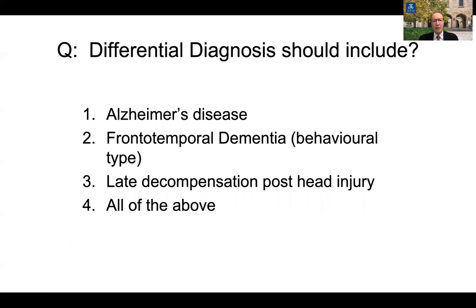Our differential diagnosis in this patient should include 1, Alzheimer's disease, 2, frontotemporal dementia, the behavioural subtype, 3, late decompensation post-head injury, or 4, all of the above.